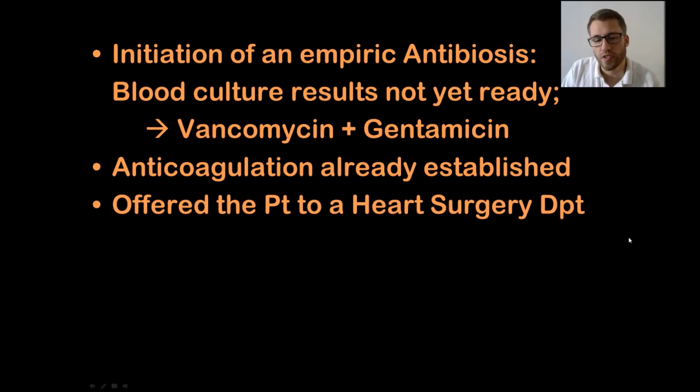We offered the patient to a heart surgery department, but they declined because they said this is a case for an interventionalist. The patient should get the leads removed via the superior vena cava, minimally invasive, without another open heart surgery, despite the fact that the vegetation was 23 millimeters big.